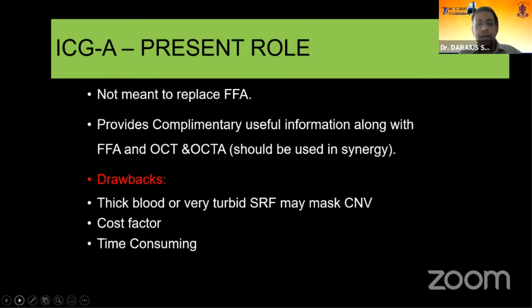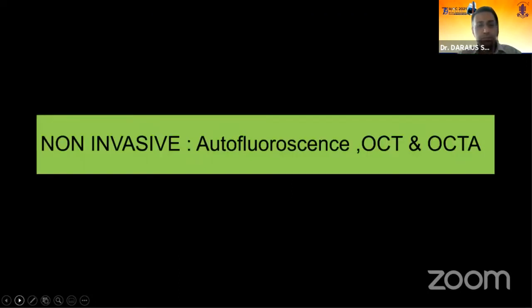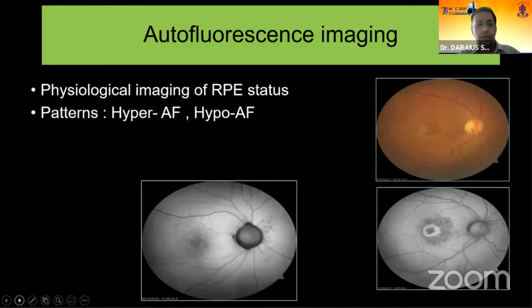And it is not meant, of course, to replace FFA. The ICG and FFA normally are done simultaneously, especially using the Heidelberg system. So it provides complementary information, and naturally multimodal imaging and synergy is the best part. Of course, it is time consuming and costly. So that is a drawback, which is why the newer non-invasive modalities are more in vogue now. And these are some of them.